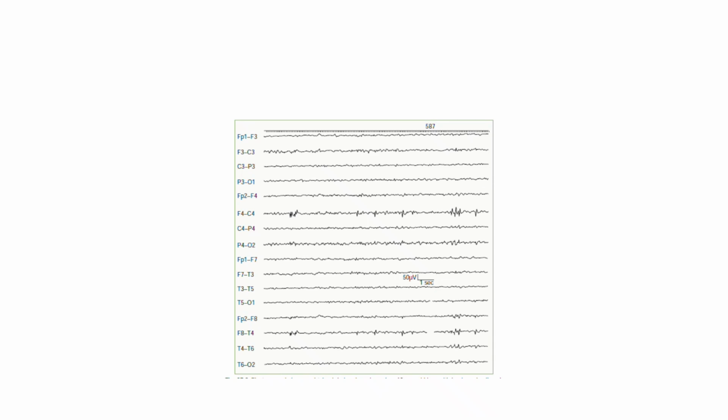3. State activation, drowsiness and sleep. The clinical note mentions this trace was obtained during drowsiness. This is a classic behavioral feature of BECTS. While these spikes can occur during wakefulness, their frequency and abundance characteristically increase dramatically during non-REM sleep and drowsiness, sometimes appearing in bilateral synchronous bursts or shifting from side to side.